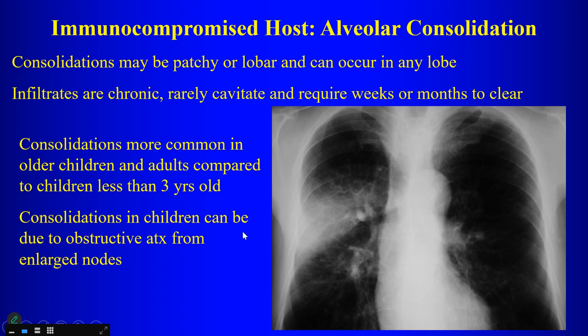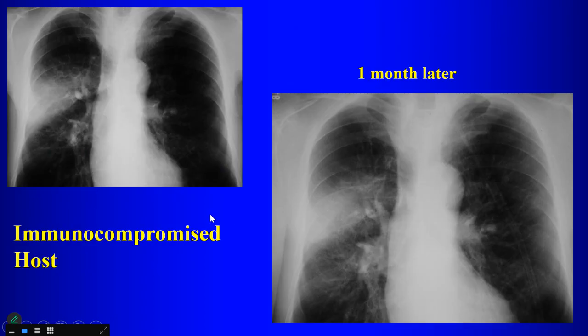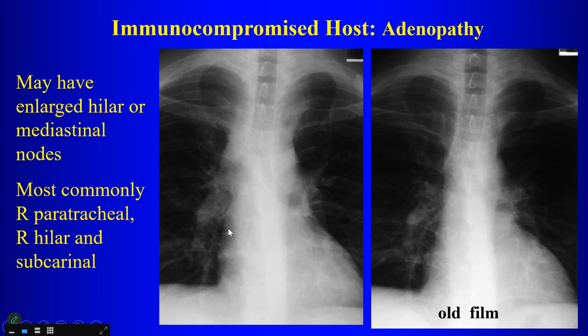So even if the patient is on TB therapy, you'll see that you don't repeat x-rays every week. The x-rays are repeated months apart. And you'll see that there isn't much change actually within the x-ray from 1 month to the next month. So the consolidations do take a long time to clear. Here's a patient, consolidation from tuberculosis, still there 1 month later, really doesn't look any different, even if the patient is receiving therapy. Okay.